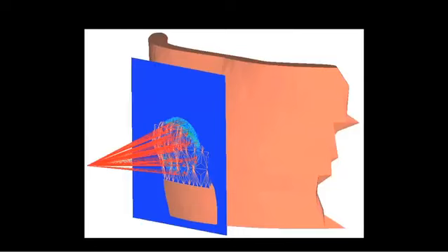This chest wall example was used by the Brody School of Medicine to examine photodynamic therapy treatment in a post-mastectomy patient. They've used an external LED-based source and are illuminating the chest wall in order to activate a photosensitizer and remove any potential cancerous cells that are left over after the mastectomy.